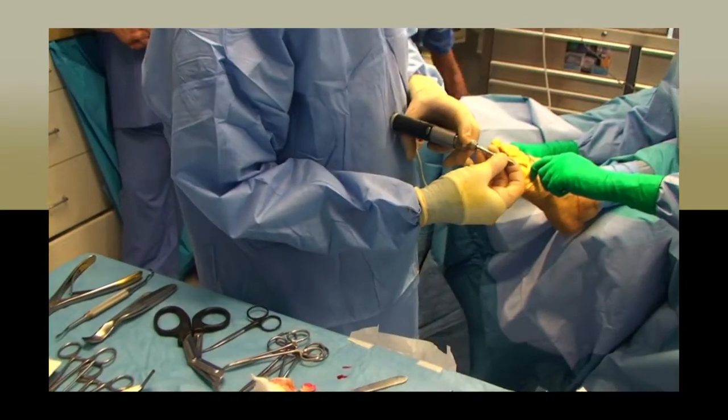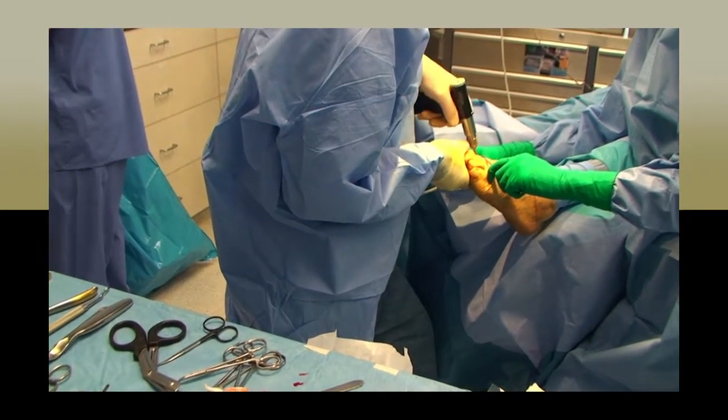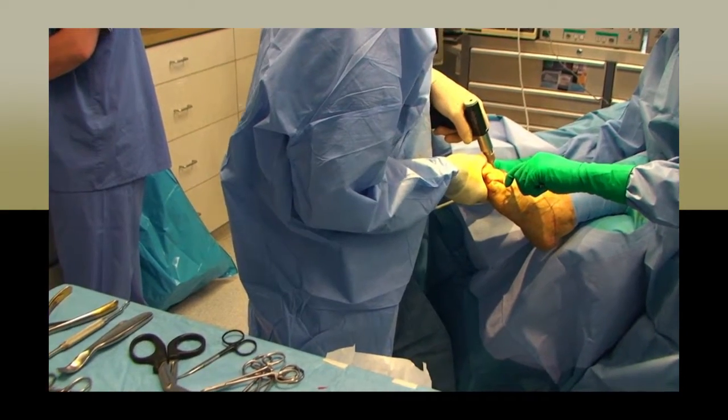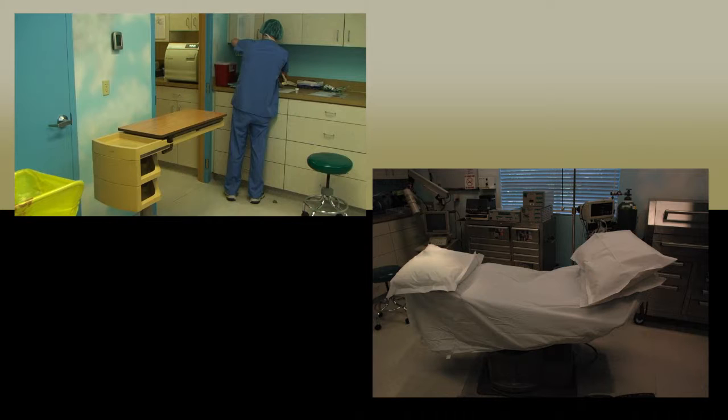Before this field is created, the surgical assistant circulator should double check any preference card and the schedule to be sure they know the procedure which is being prepared and ready all materials. They will need to ensure the room is clear of any furniture clutter. The furniture that will be draped in sterile fields should be placed in a group near each other. For instance, the OR table and C-arm for fixation type cases.